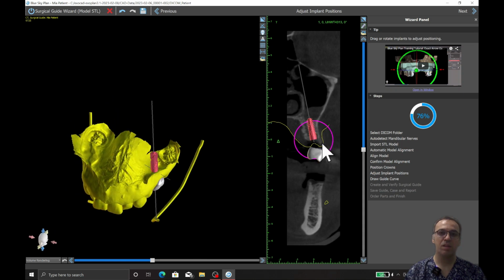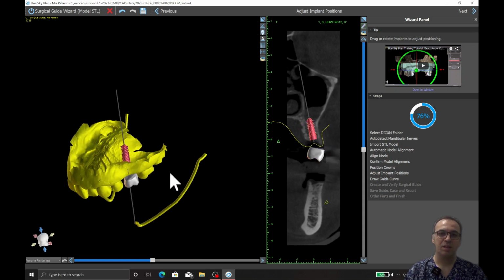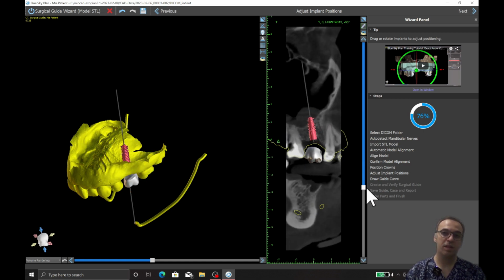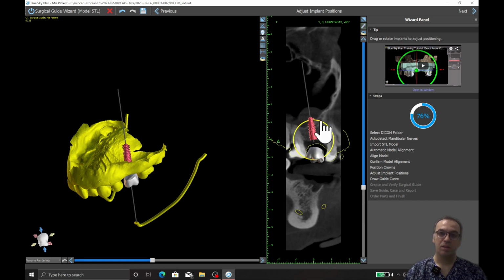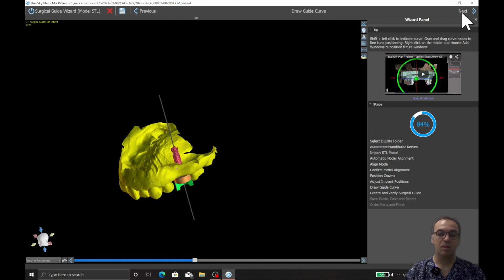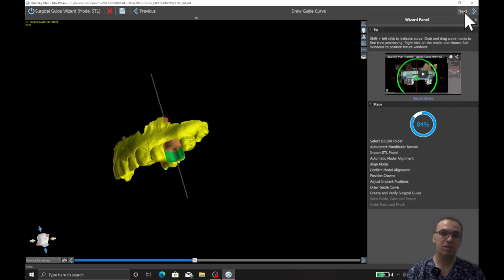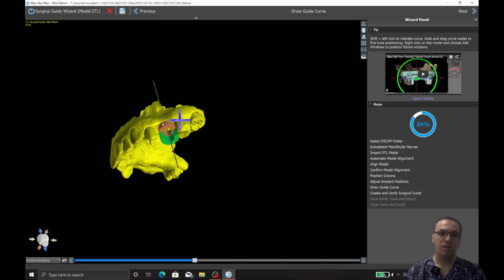Okay, so in this case I'm going to put my implant in the proper position, and as you can see, the implant axis and tooth have a little bit of angle. Maybe we should go for 25-degree angulated abutments, but it's still a good implant. And of course, as you can see, we need a closed sinus lift.